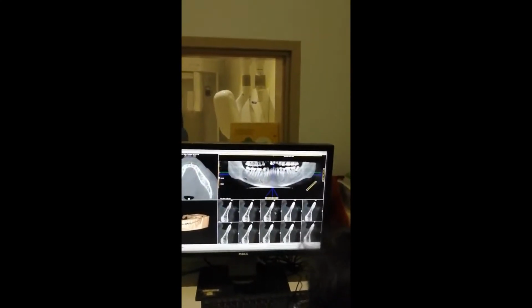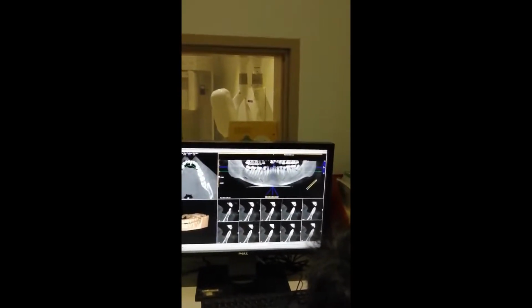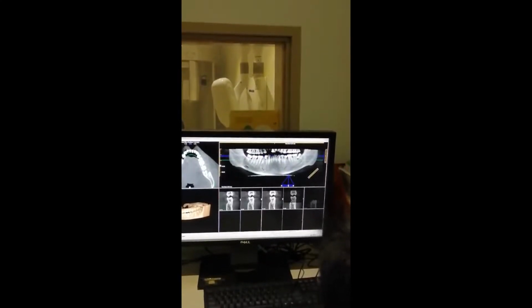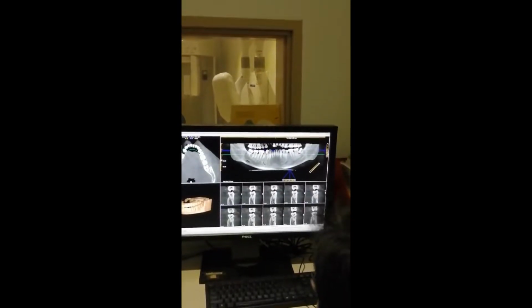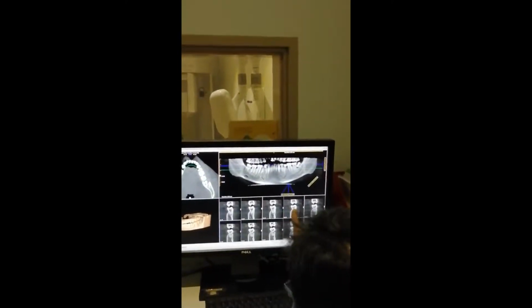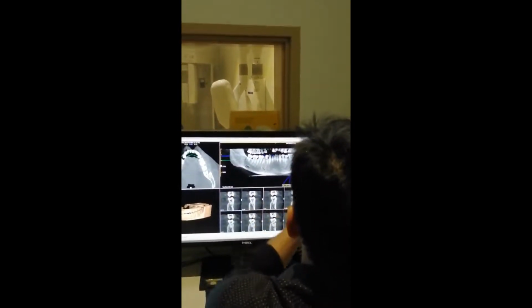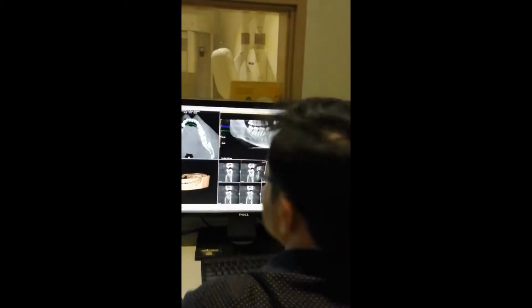You may be wondering what it is. So, if I put it up, see, I want to concentrate on the molar. What I am seeing here is the upper and lower molar now. It gives the buccal side and this is the lingual side. That means the cross section of this. If I cut this mandible in the middle and take it out, what we see is here. Can you imagine that?